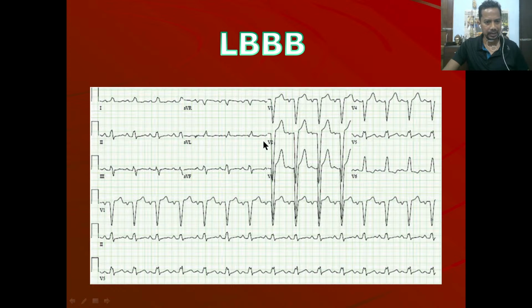Now something interesting you are seeing out here. P wave is tall, okay, but more than tall, it is broad. It is almost the size of the R wave in width. Okay, so just make a mental note of that.